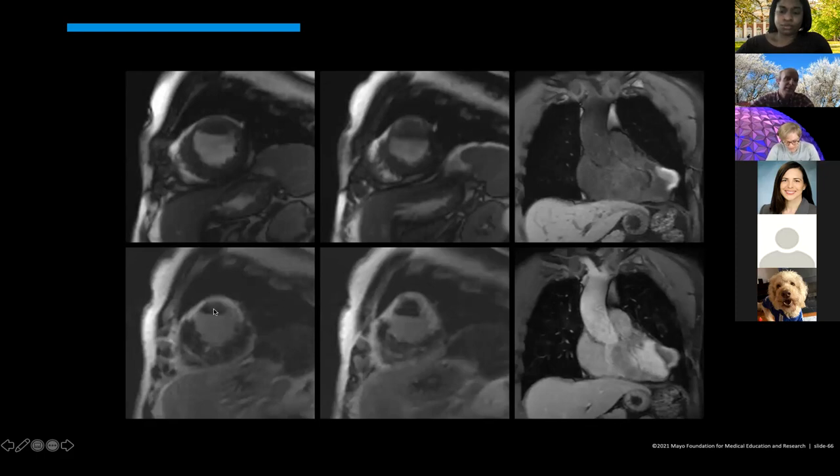And a couple things I would point out here on these images is the transmural infarct that you see in this aneurysm. So you have a transmural infarct, that's not going to get better. The thrombus inside of it is very, very dark. It does not enhance. On the T1 weighted images before contrast, thrombus in the heart looks like thrombus in the brain.